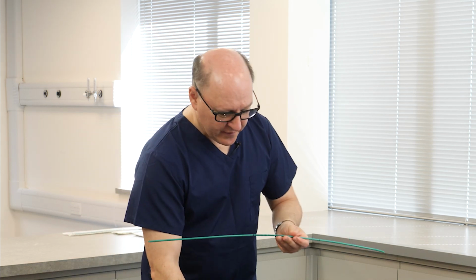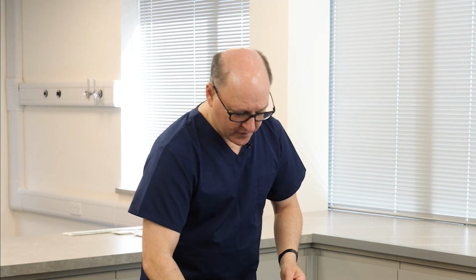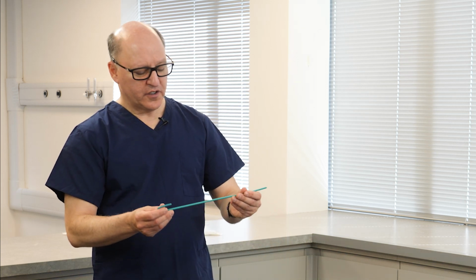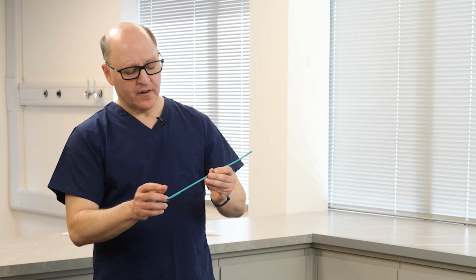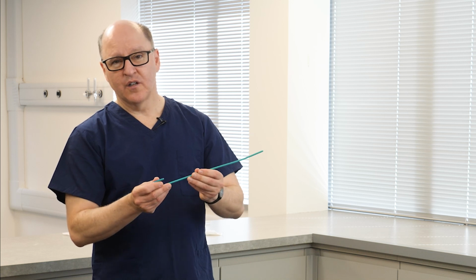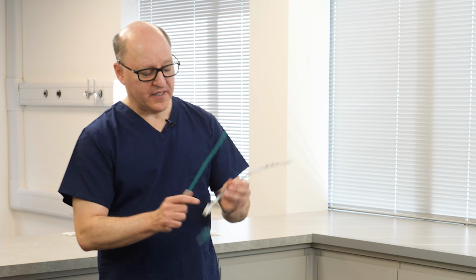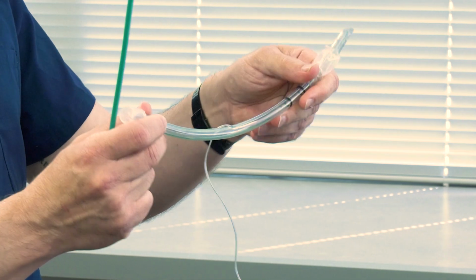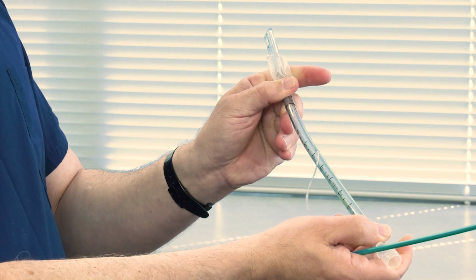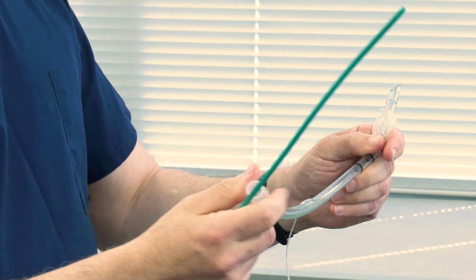And then in the 1960s, 1970s, a number of manufacturers, especially in the US, promoted the use of a malleable stylet. And these are either steel or aluminum with a thin plastic cover over them that could be placed inside the tracheal tube to straighten it out and basically give it a long and narrow shape with a distal deflection similar to the bougie.